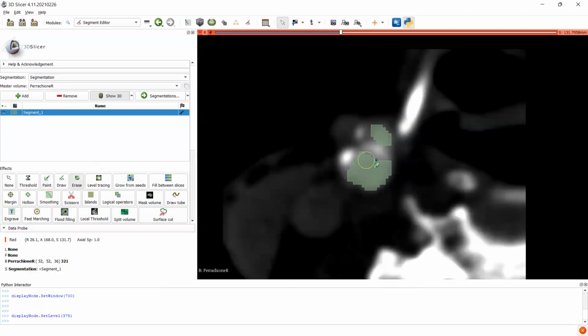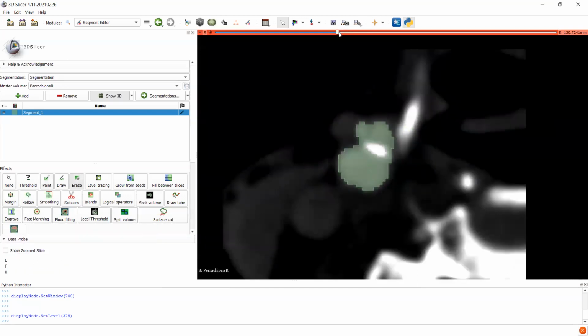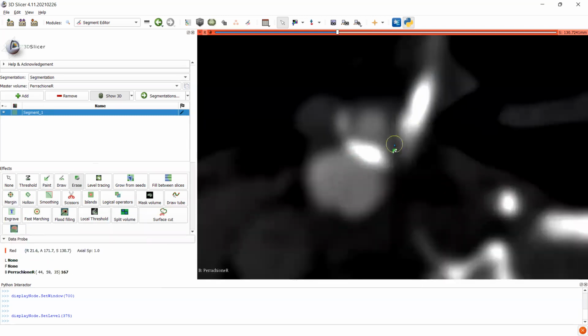The major point here would be catching the fact that they've actually separated. You see, Slicer is really bad at this. It can't see the separation. So this right here is completely wrong, and that's why you have to manually fix this. This is not flow lumen either.